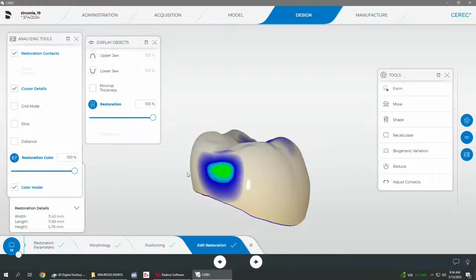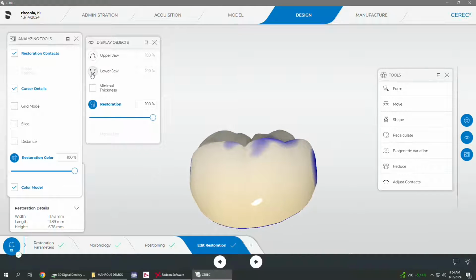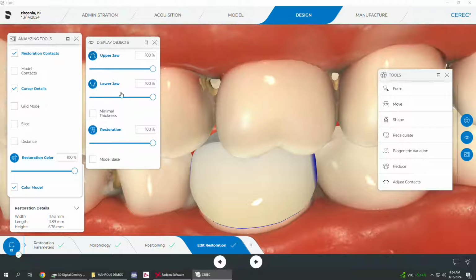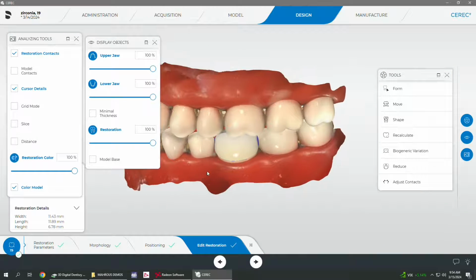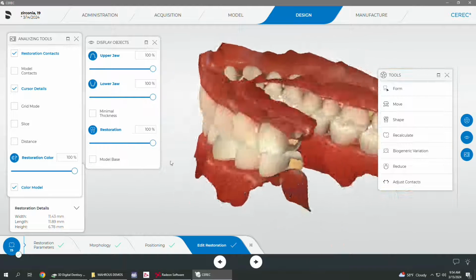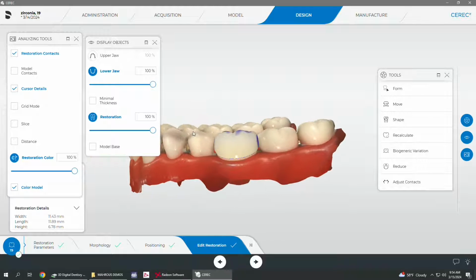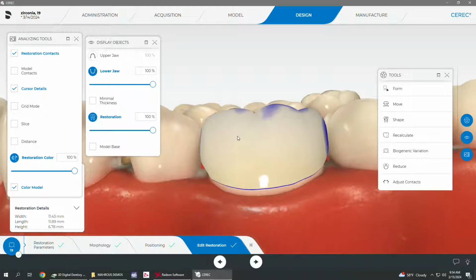You generally would like to see the green on both sides. Some people would like to create a little island of yellow within the green and then adjust it intraorally. It is common to need to adjust the areas gingival to the interproximal contact areas in cases with large interproximal embrasures, as is the case in this typodont here.